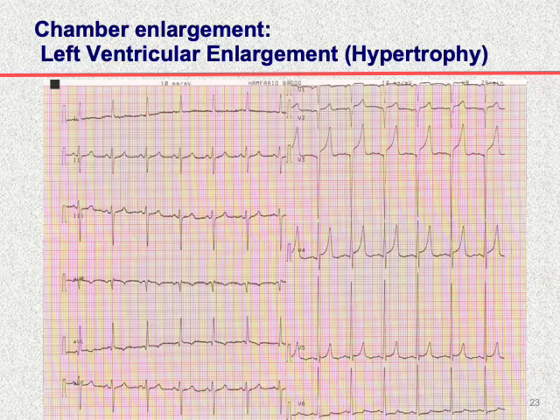And this, as we see here, is LVH. This is again sinus rhythm, but this is deep S in V2 and tall R in V5 and V6. We count 1, 2, 3, 4, 5, 6, 7, and this is 1, 2, 3, 4, 5, 6. So we have 13 large squares, let's say 65 small squares, and we will diagnose LVH if it is more than 35.